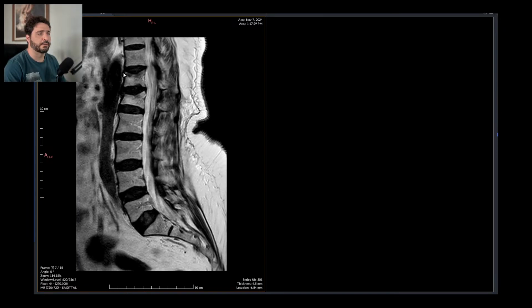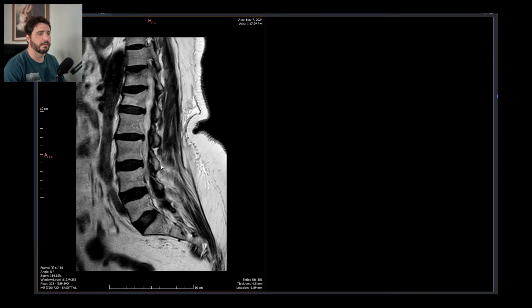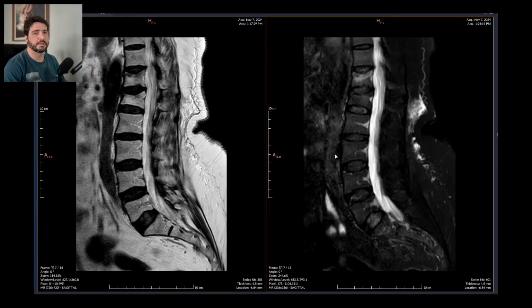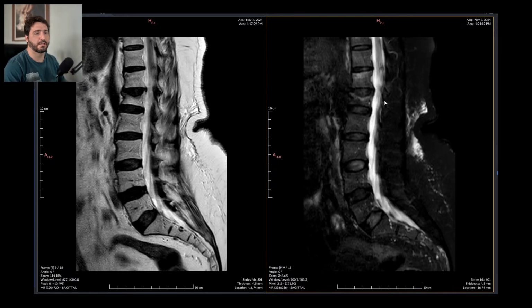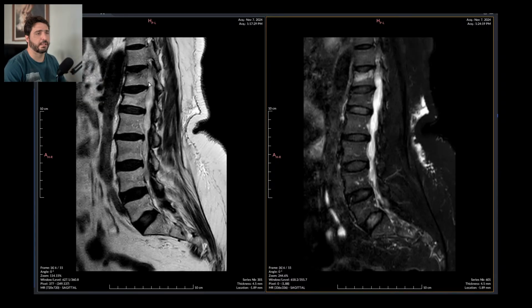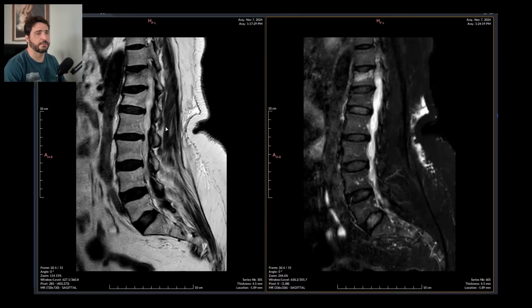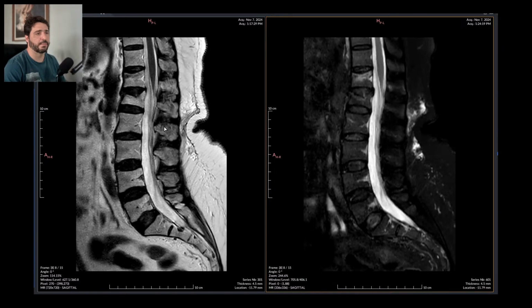We have an acute fracture right there, another acute fracture right there. How acute is it? It's very acute. See? Also acute. It's an acute fracture in a collapse of D12 and L1. This is 2, 3, 4, and 5. So no wonder she is in pain.